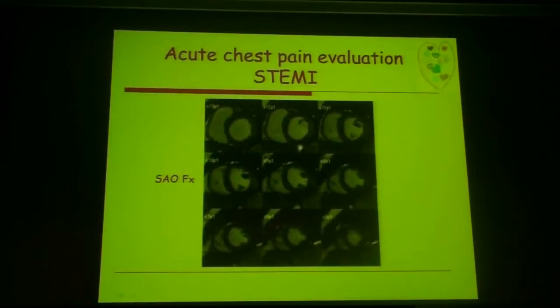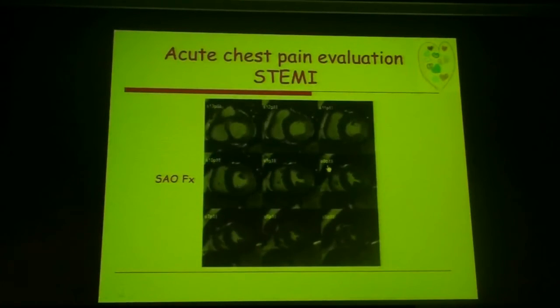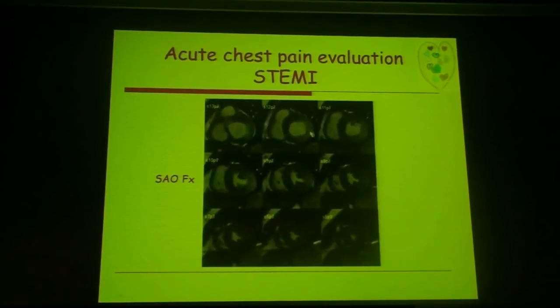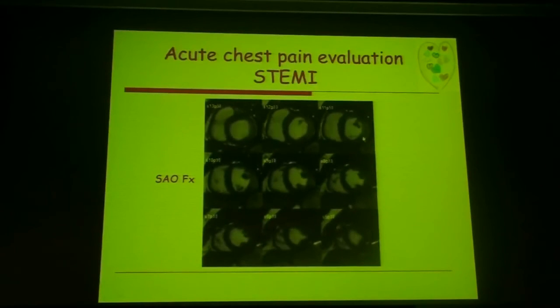Okay. We're continuing to the cine images, these function images we're acquiring. These are bright blood images. They do not require gadolinium. However, as I mentioned before, sometimes we do acquire them following the administration of gadolinium, just because we're trying to shorten our scan time. So as we're looking here, take a very close look at the lateral wall. The lateral wall is hypokinetic. It does not contract as well as the rest of the walls, when we compare it to the anterior wall, the septal wall, or the inferior wall. We can see that the lateral wall here is more hypokinetic, but not only that.